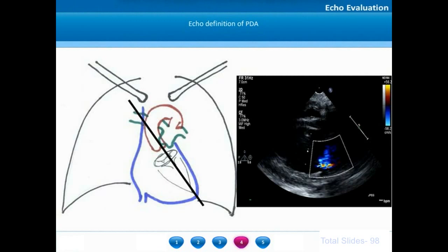The base of the heart will be at the level of aortic annulus. The adjacent echo video of a parasternal long axis view shows the long axis view of the left ventricle, which shows the left ventricular inflow and the left ventricular outflow.